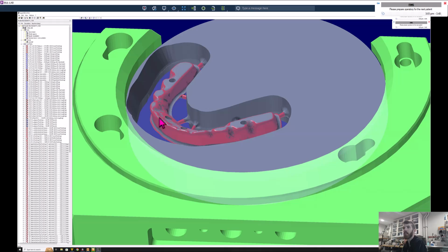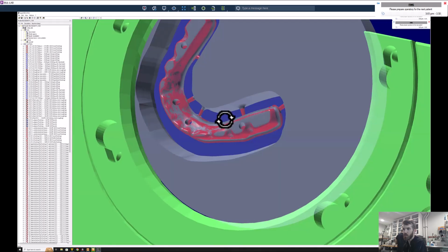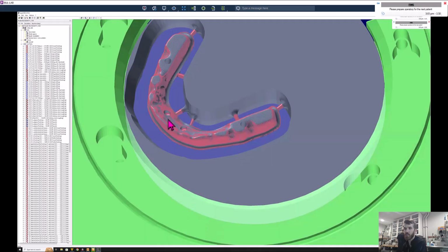So for our office, we calculate the results of every job before we mill them. You'll also notice that the sprues are on areas that are not going to be cemented to. So again, these parts should fit directly out of the mill.